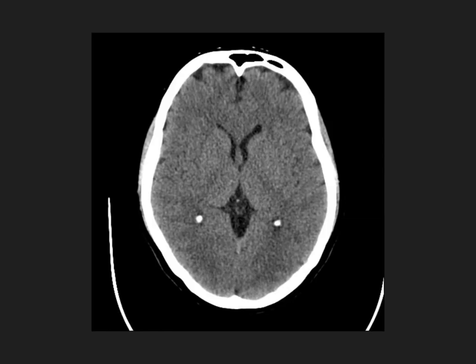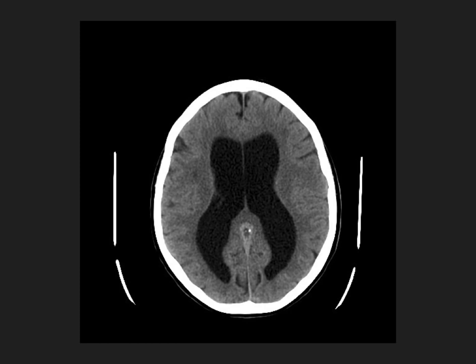This is a normal CT scan of the brain. We can see adequate brain tissue, we see the sulci and the gyri, and really nothing abnormal here. This is what's considered a normal brain scan. Now, look at this being normal and then ask yourself, what's going on here? Pause the video if you need more time, but what we're seeing here are massively dilated ventricles. And if I were to tell you that you have massively dilated ventricles, what's the diagnosis? Well, that's going to be a hydrocephalus.